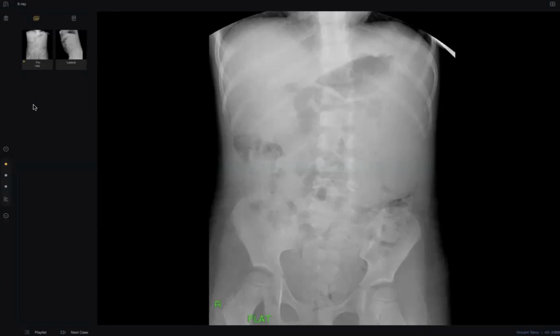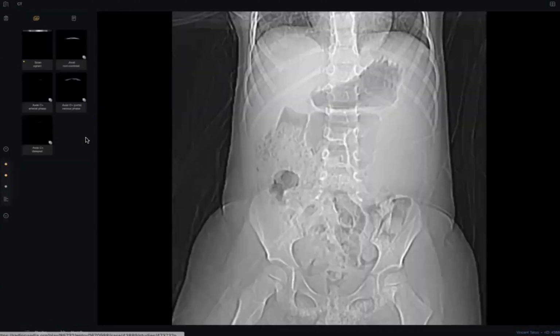The bones appear to be fine. Very minimal scoliosis is there, and there is no air lucency or free air within this abdominal X-ray. So I'm suspecting a left renal mass lesion. What is your next step? Next I would proceed with the ultrasound. Sir, I would also check any bony abnormality if a lateral or any other imaging is available, but ultrasound will further evaluate.